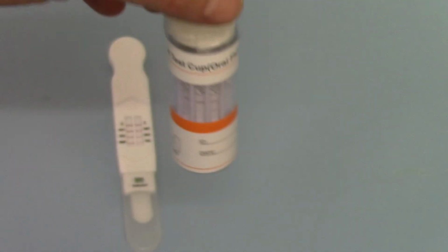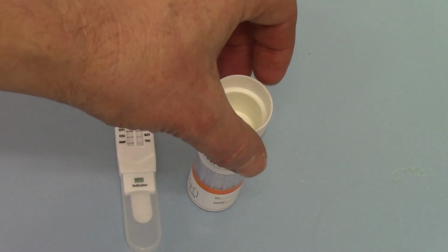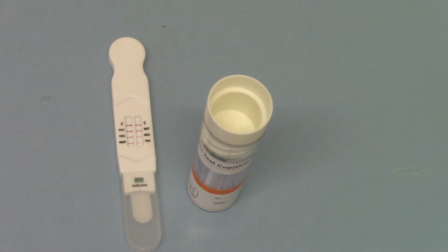So you will see that there is naturally a great variation in the test line density, colour saturation, and that is an entirely normal feature of not just saliva tests but also urine tests. It does tend to be more pronounced on some of these supersensitive saliva membranes compared to their urine equivalents, and that's simply down to the low nanograms per mil concentration that you're expecting these tests and the manufacturers set them to work at, the very nature almost dictates that the test line is going to change and be, in some instances, quite thin and faint.